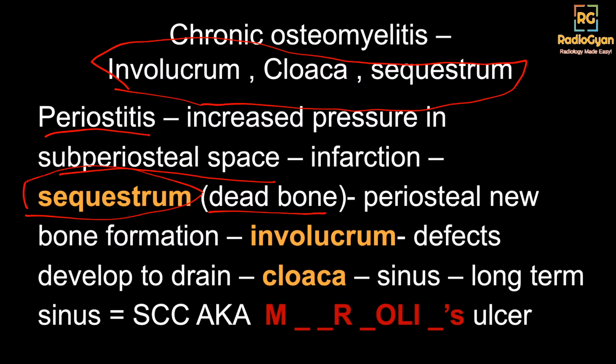There are multiple types of sequestrum: button sequestrum, ring sequestrum. So you can read about them. Some pathologies are associated with each of these subtypes of sequestrum. Typically, where do we see button sequestrum? So there are multiple pathologies in which we can see a button sequestrum. The typical description is that for an eosinophilic granuloma. It's not specific, but you see it in multiple pathologies.